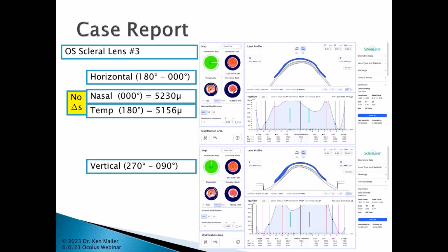As far as getting too thin, I always look at that picture to make certain that I have something that doesn't have any sort of strange little angles that may present a weakness in terms of the actual material's stability when it's getting manufactured, or if it gets manufactured, then once it's on the eye, that the patient can easily break it. So that's where I would be observing to see if the lens is getting too thin or not.